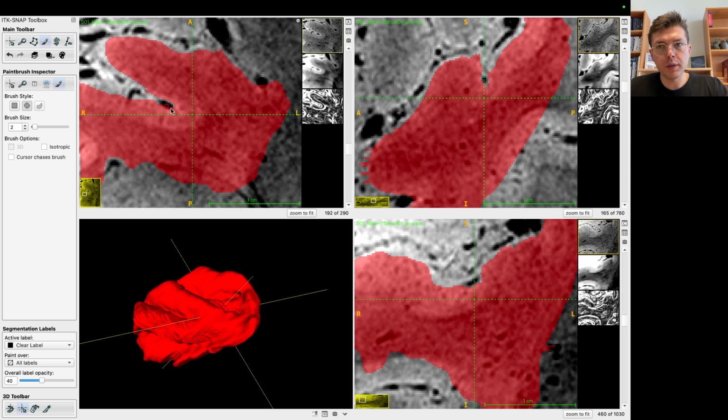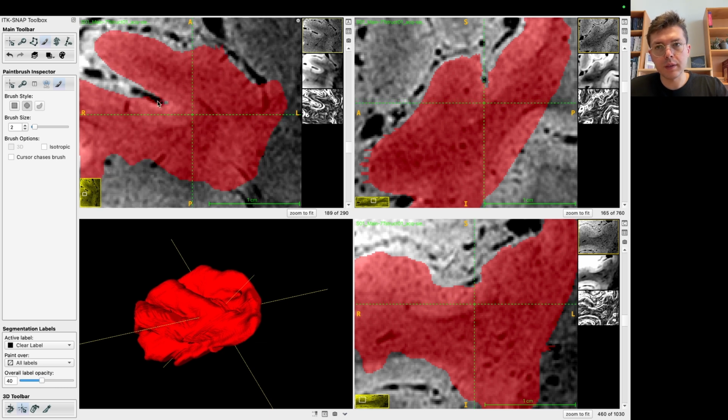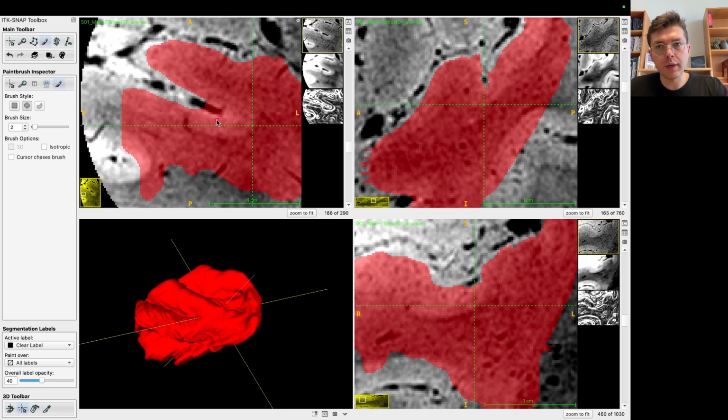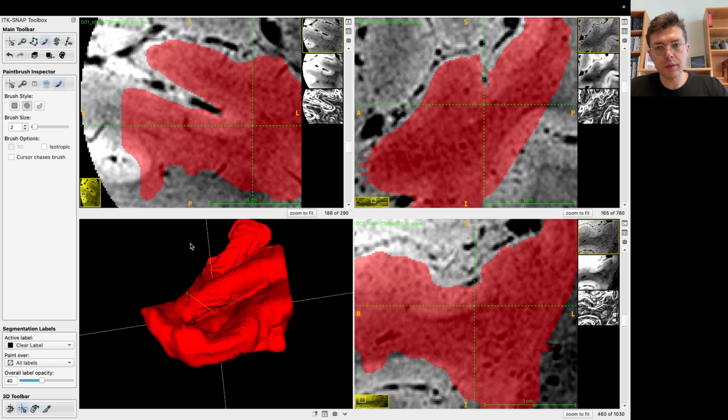See, I'm just opening it up based on that dark thing. That guides my outer gray matter boundary. Hopefully it's visible nicely here. Maybe I set this up for you like this.